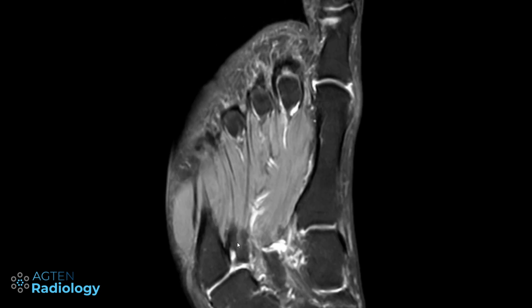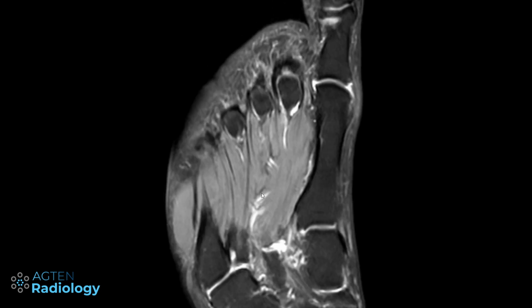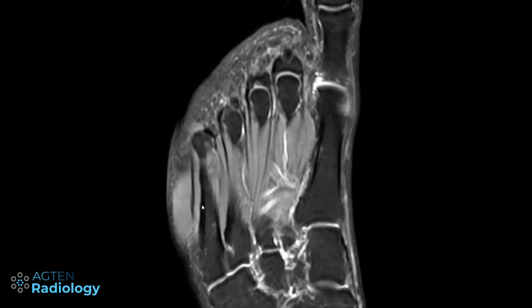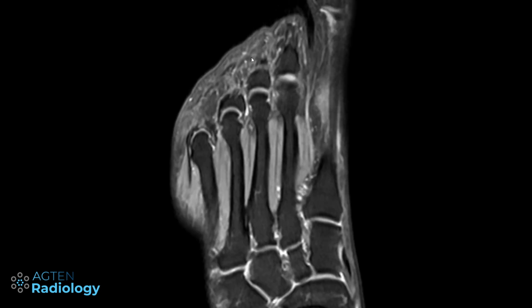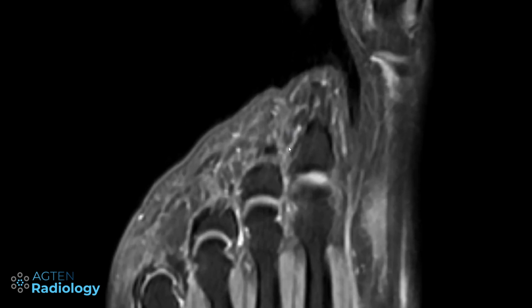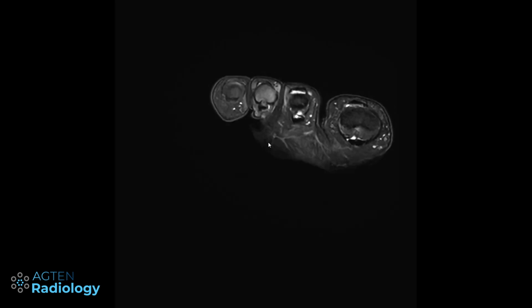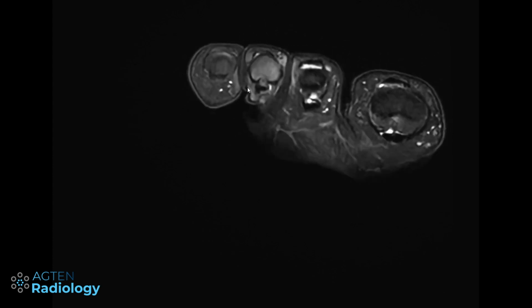concept. Then from this arch that's going over here, there we have the metatarsal veins that are going off, more or less parallel to the metatarsal bones. You can see there are small vessels here in this foot, nothing too crazy. And once we reach the toes, basically they split up, and then we have these veins on either side of the toes. These are the plantar digital veins, which we are not caring about too much. Even if we try to find them, it's the small stuff that's going down. So we are not really interested in those.